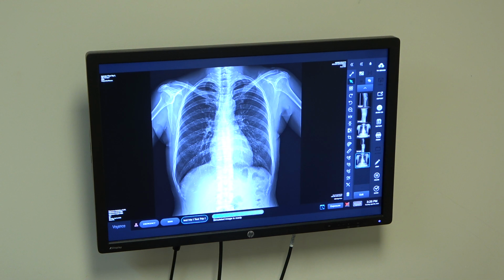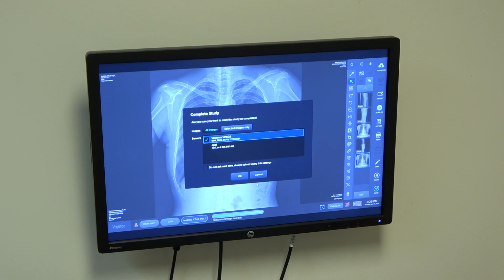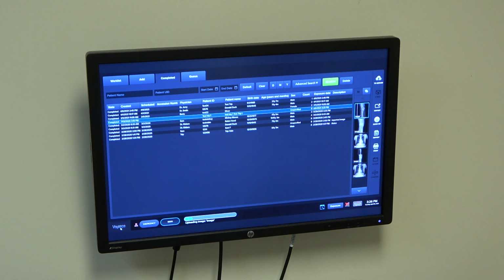And since we'd had all the rotation set on this to automatically horizontally rotate it, then it did automatically rotate the image. It applied all the correct algorithms, and you've got the images finished. So the other thing about this panel, I'm going to hit this as being done, finish this.